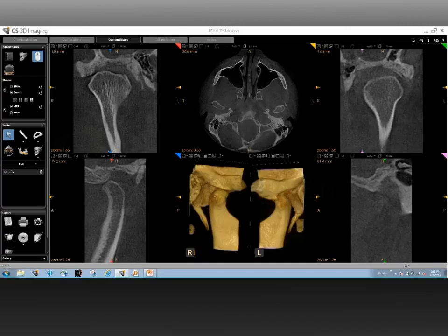Yeah, it's so helpful to watch you navigate through here. I mean, that's the key word. You're moving from anterior to posterior. You're moving from medial to lateral, and it really demonstrates very clearly what is lacking in a 2D TMJ view.